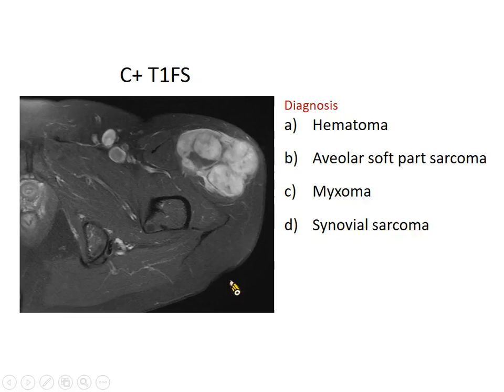Wow, pretty good. Synovial sarcoma. Synovial sarcoma doesn't mean the tumor around the synovial joint. It is totally different. It's not relating to the joint and not relating to the synovium, although the term is misleading. So synovial sarcoma is a sarcoma with 30% with calcification.